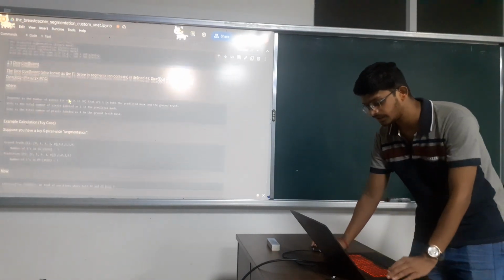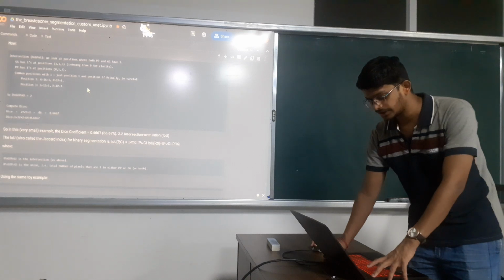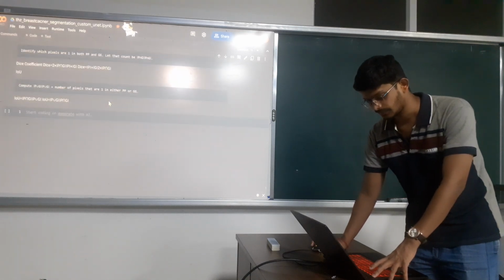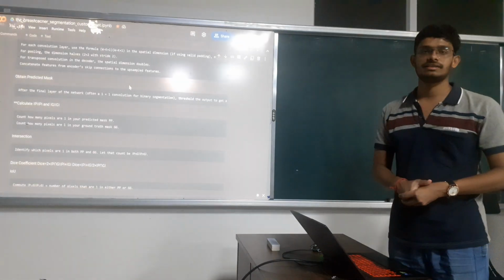And finally, I have presented the whole mathematics of how the dice coefficient and IoU score work. So this is my complete project regarding the SIC AI.